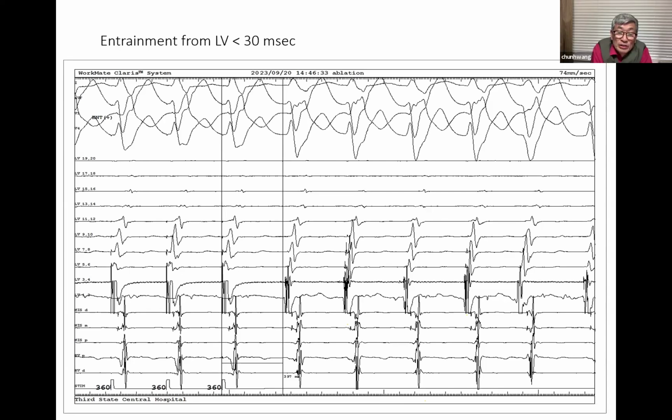It is not uncommon in young patients. You will have some form of conduction system VT or papillary muscle VT. Papillary muscle also involves Purkinje fiber, remember? So therefore, retrograde conduction through the conduction system is going to be much faster than local conduction. So you will see the His bundle preceding the local QRS complex. Okay, it's mainly timing and also involvement of the Purkinje network. So that's the challenge of papillary muscle versus fascicular VT in a young male patient, and the EKG is so crucial. Surface ECG, okay?